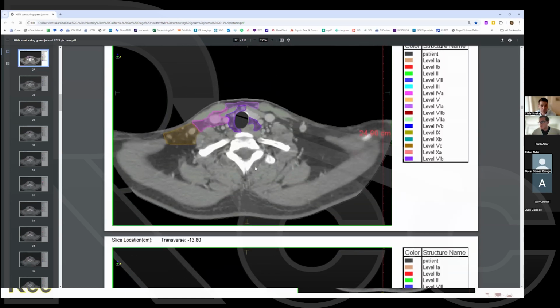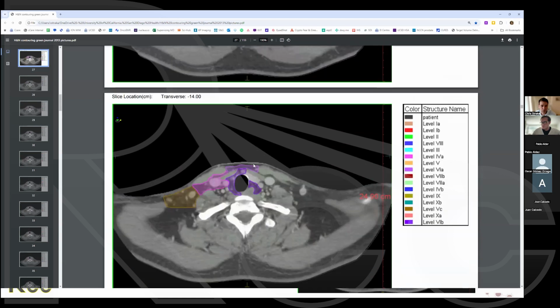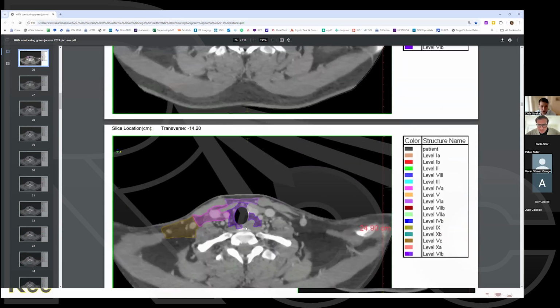And so that's why, when you're covering particularly a thyroid primary where these are really first echelon, you just don't want to miss them. Most people will contour this whole thing because it's hard to not miss unless you're really looping out and having the esophagus included.